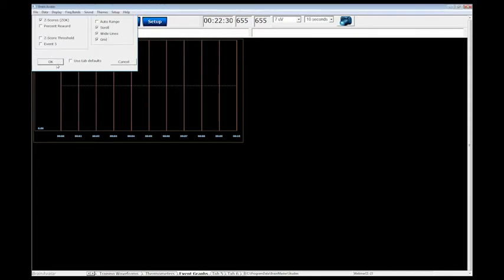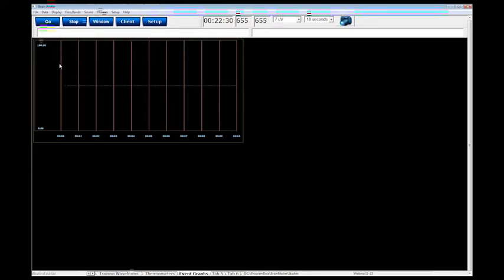But that is basically, in a nutshell, some of the different displays and some of the different things that you can do along with your panels to customize them so that they work for you. You can put in the information you want to look at, you can take out information you don't want to look at, and you can move things around. That's the basics that we're going to cover right here before we start really going into the full designing.